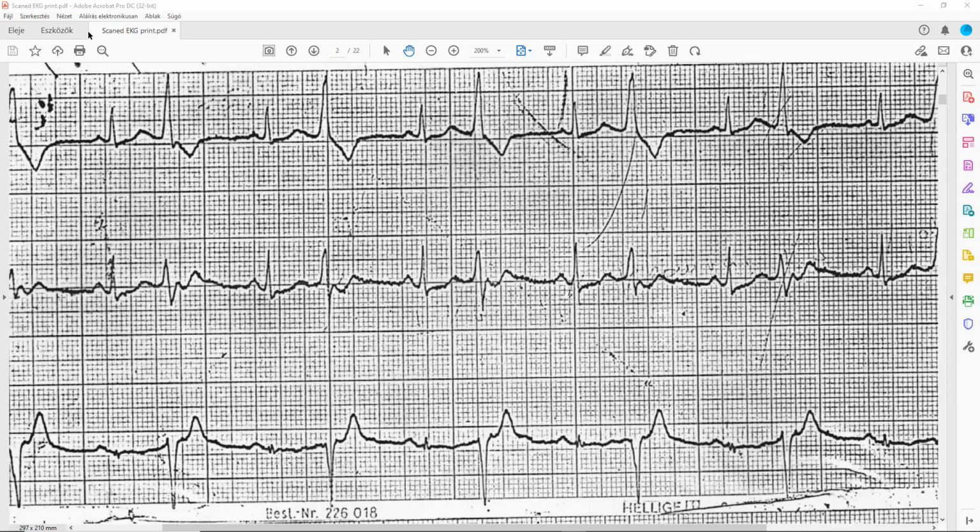I am back. All right. So, do we have a P wave in front of every beat? No, we don't. I have a question. Do we consider the small peak in the front as our QRS complex? No, let's look. This is a P wave. Can you see it? That's a P. That's a QRS.